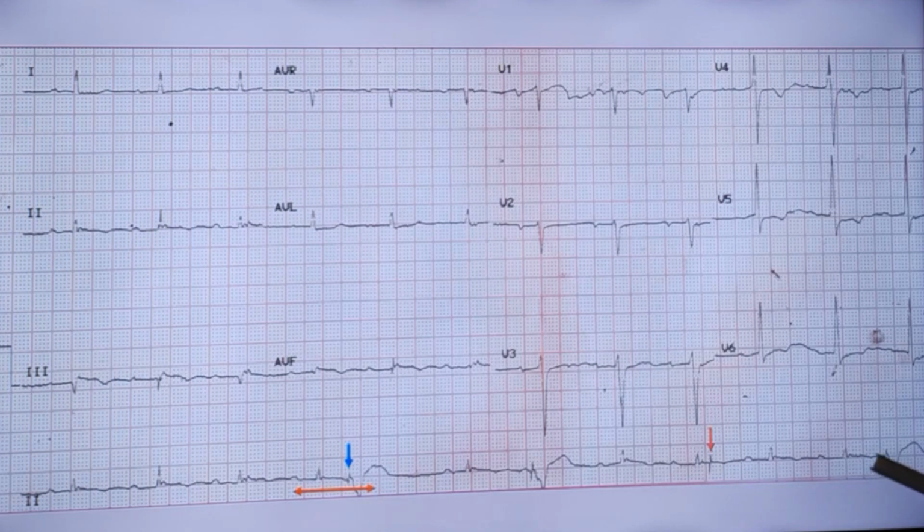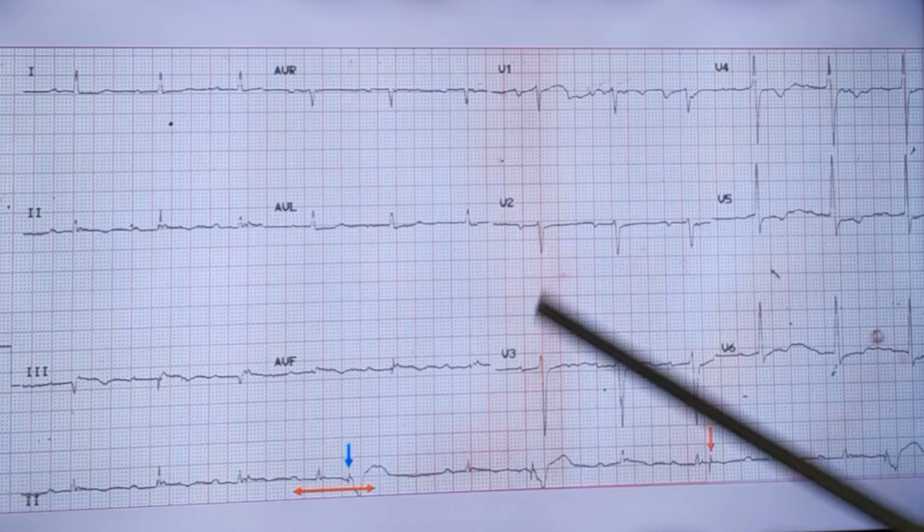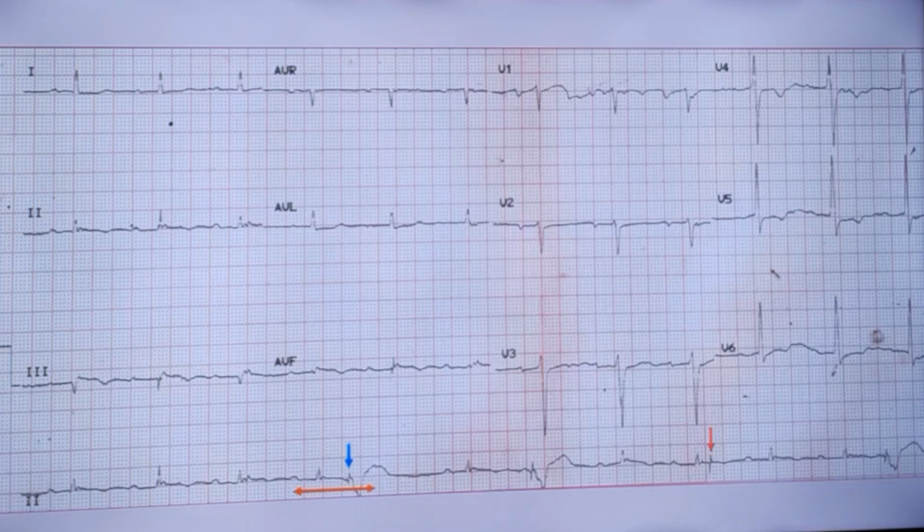Then you have another pacing spike here and a QRS complex with T wave. So overall it shows that pacemaker sensing is abnormal. Then we do not know the set rate of the pacing function, so you cannot say much more on that. But when you see this in the setting of inferior wall infarction, probably with temporary pacing and a pacing sensing failure, the first possibility which you should think of is displacement of the lead.